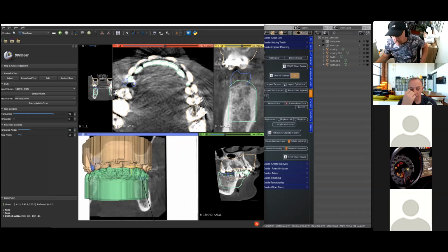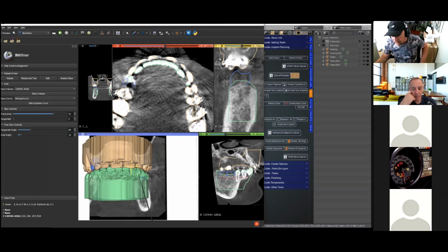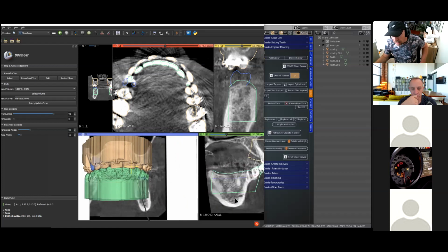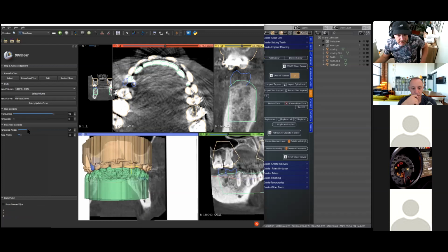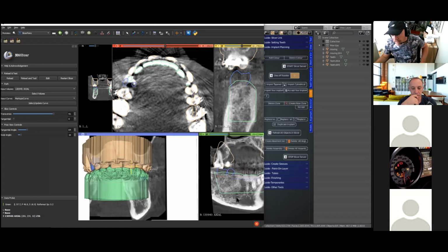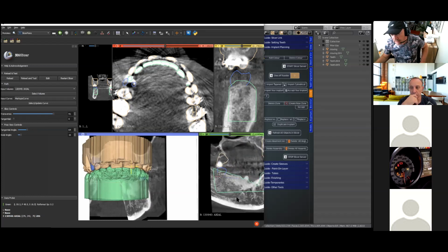And then I'm scrolling on the green slice and I can see the exit, but yet it's not that clear. So I'm going to be moving this slider maybe a little bit different. Round about there, moving through, and then just so that you'll be able to see it. There we go. So we've got it there. Okay. This takes a little bit of practice to understand how this works.